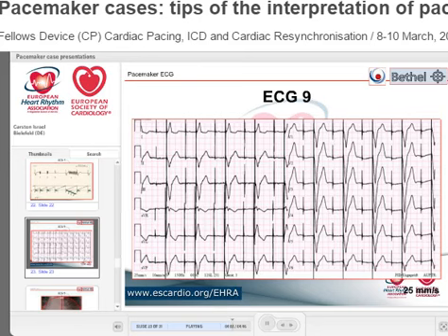So why I say, is it RV apical or RVOT? Somebody said it's in RVOT. Somebody else said it's in RV apex. Why can you know for sure this is in RV apex? Yeah. Leads Roman 2 and 3. You remember? From left and right arm down to the lower part of the body.